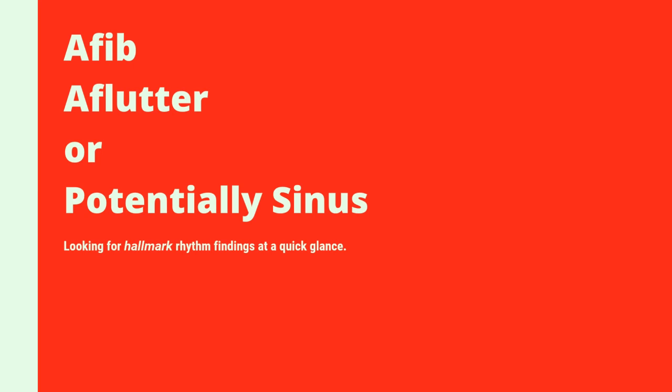So I wanted to be cautious not to put sinus rhythm because in order to really confirm a sinus rhythm, you absolutely have to go through your full 6 steps to interpretation and measure all of your intervals and waveforms to make sure it all conforms to the normal limits. But just based on pattern recognition alone, you should be able to start differentiating between these 3 very common rhythms with quick rapidity and very high accuracy at the paramedic level.